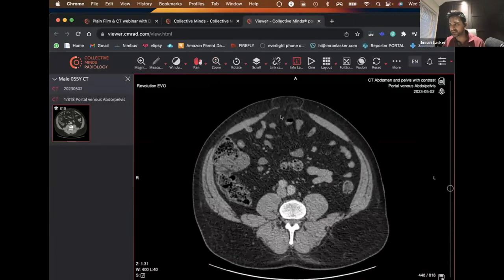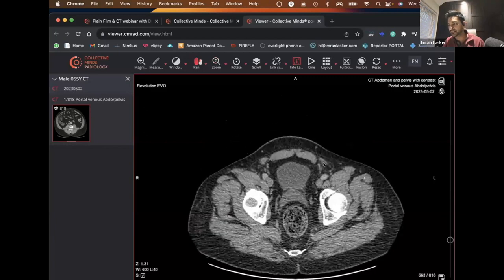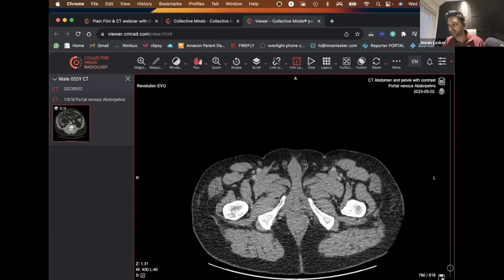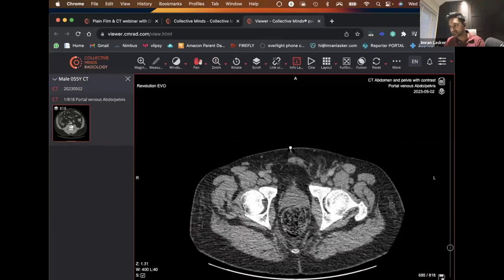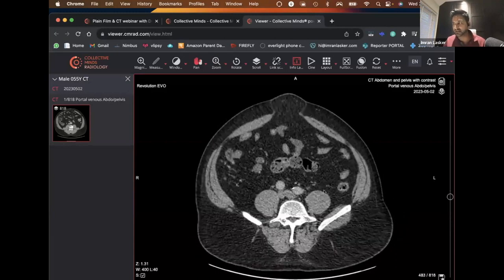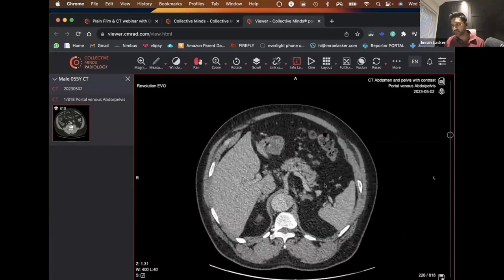And then bonus points, I guess, not particularly important, with this particular patient they do have a periumbilical hernia, and they've got inguinal hernias located in both groins as well. Can you see that? So the little inguinal hernia on the left contains some fat. Generalized subcutaneous edema as well, which is pretty much unrelated to the overall picture of the patient. So yeah, we've got a patient who's got aortic dissection.